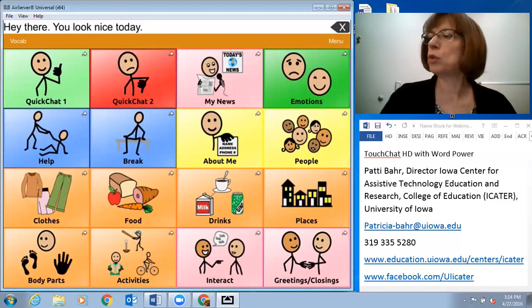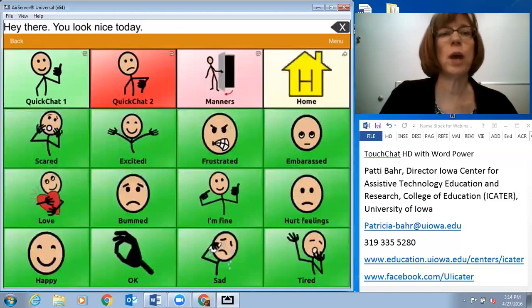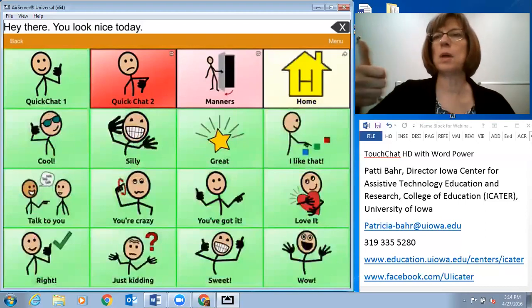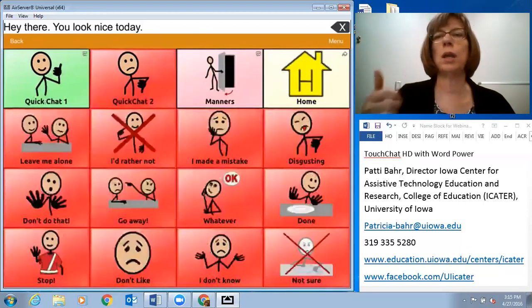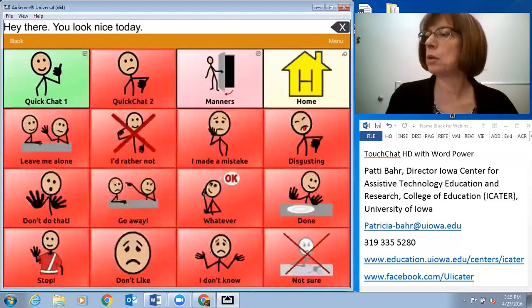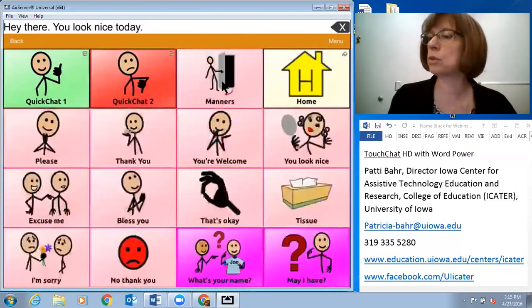So if I go to emotions, for example, I've got some quick chat things about emotions. So these are thumbs up, these are positive things. And here's quick chat negative things, thumbs down. So these are, you know, I'm done, go away, whatever. And you can do manners, of course.